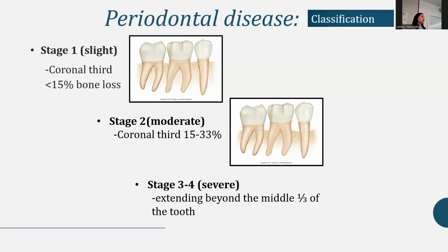After being a hygienist for 20 some years, I still struggle. But you basically have to look at the root and chunk it up into thirds and just do your best. You're here for 2 years to make a choice, talk about it with your faculty, and learn from every discussion, because it's not always black and white.